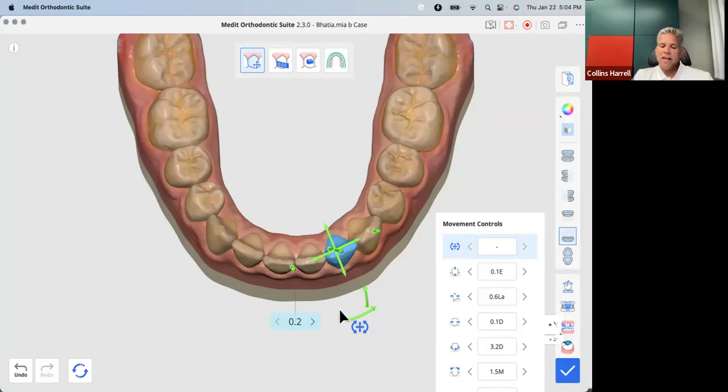Because the problem with that is that is making everything manual. And the nice thing about this is that it's all automated, meaning it's fast. And so you can set things up a lot faster, but you're also kind of stuck with the auto staging rather than having you do it all manually. And the dream is, and what they're working on right now, is being able to give us the combination of both, where you can do manual when needed. So go override the timing and the staging, but it still does most of it auto staging so that you can go a lot faster on the cases.